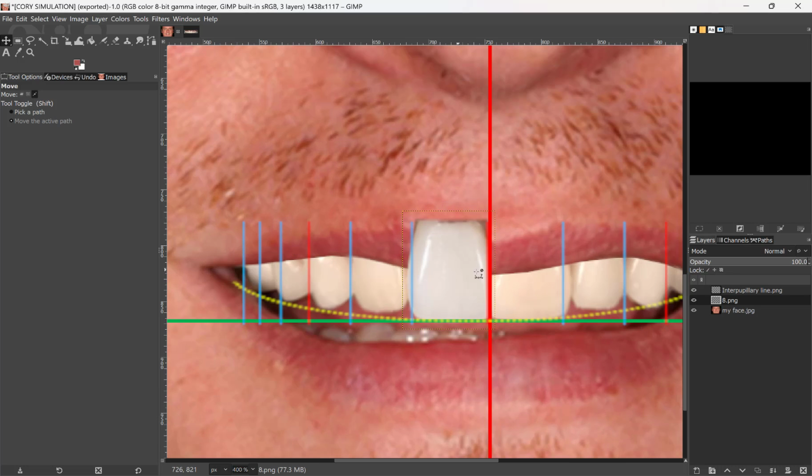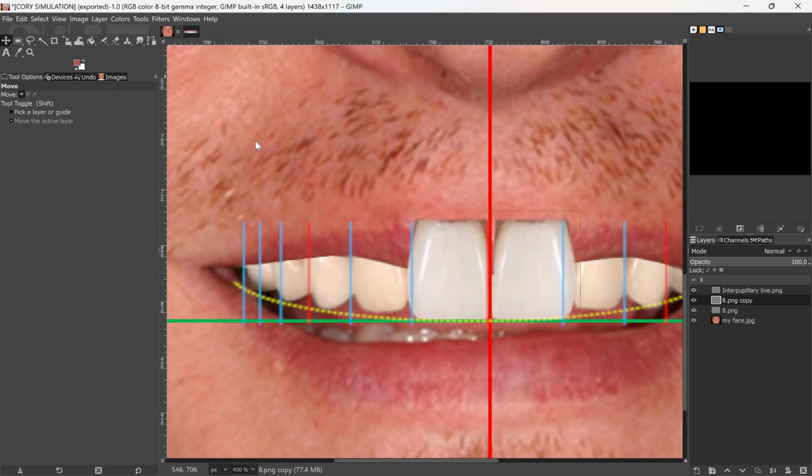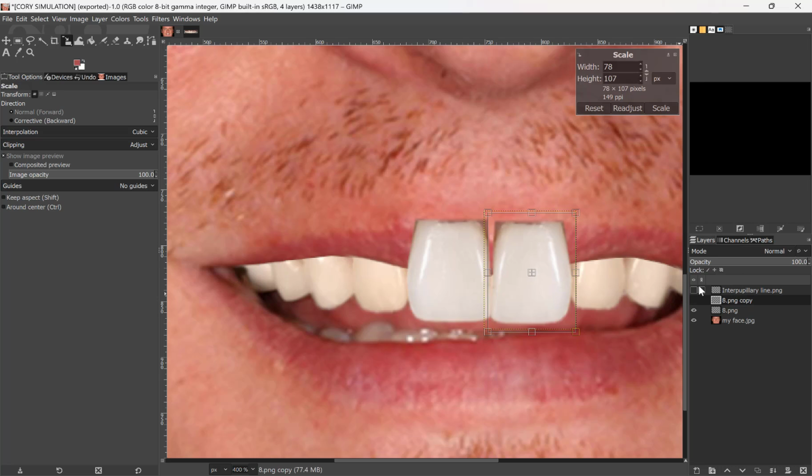For example, here, my right, I pull in just that tooth, individually position it, and then I will go to transform and say flip horizontally. And now you see I have this mirror image, which I can pull to whatever specs I want individually on that too. I could pull it, make it a tiny bit skinnier, perhaps.